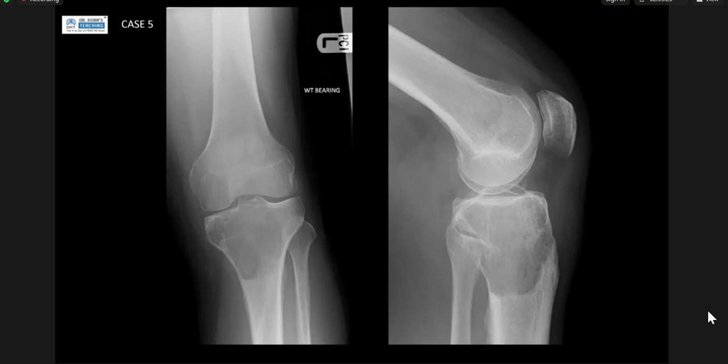You said narrow zone of transition. Can you talk to me a little bit about the lateral margin of the lesion? The lateral margin of the lesion is not sclerotic. There is no sclerosis surrounding it. However, I see it as partially sharp or partially irregular. It's defined partially, so this is confusing to me as a narrow zone of transition here in the lower border of the lesion. Okay. And what do you think about the cortex of the medial proximal tibia?